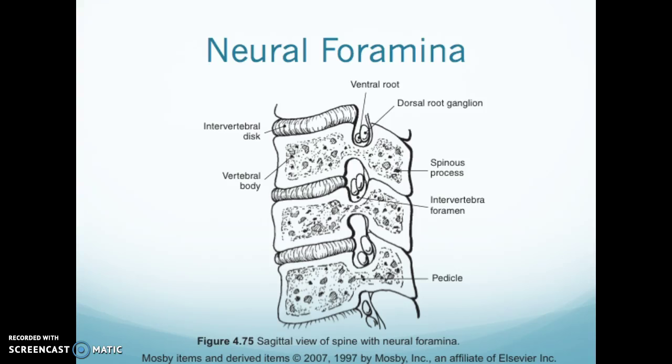Okay, last video for the spine. Here we're looking at the neuroforamina. So we have the ventral root, the dorsal root with your spinous process. Here's your vertebral body. Here's your intervertebral foramen with the two within them. So in your pedicle heading posteriorly.